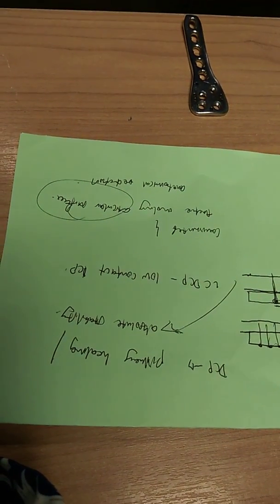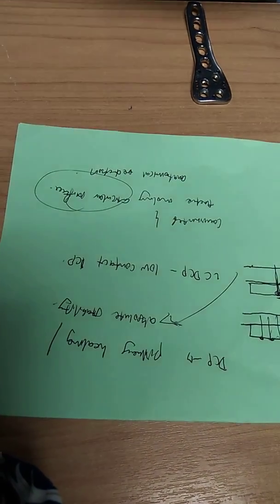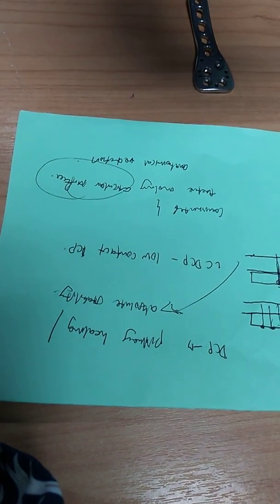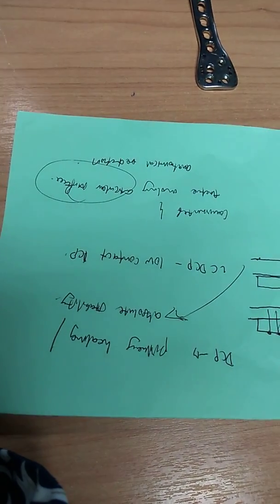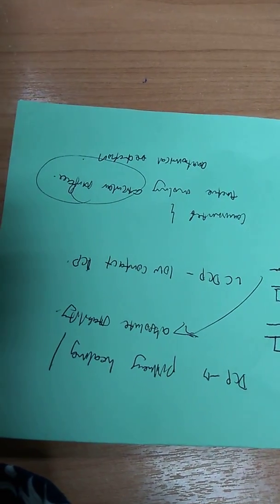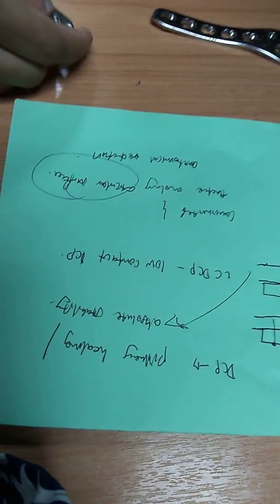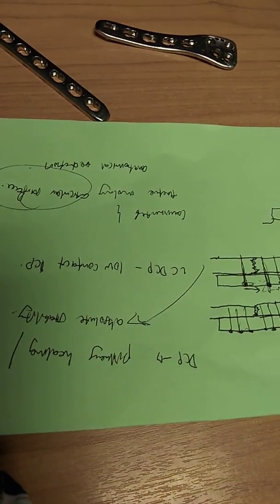Okay. So locking plate basically has the same two screw holes as DCP has, but the eccentric hole is threaded. So that means you can compress the screw, and at the same time you can put a locking head screw. You won't find threads here on the DCP, but you'll find threads here in the LCP locking plate. So the thread area is for compression as well as placement of the locking head screw. Now, this is a locking head screw, whereby you can see the screw head has threads also. Okay.